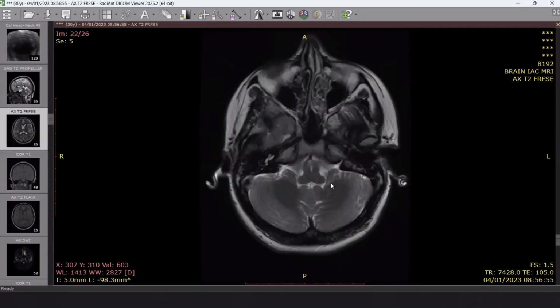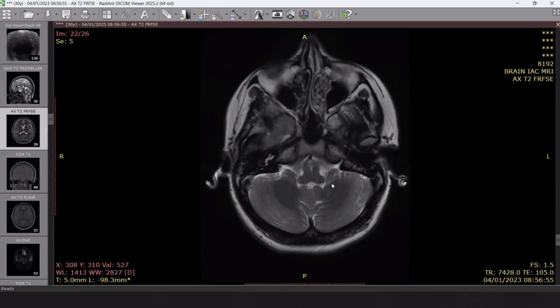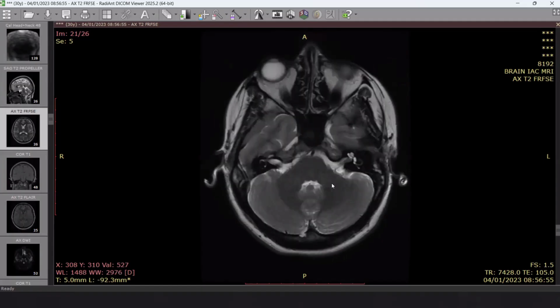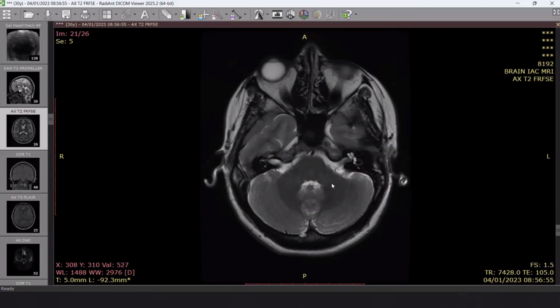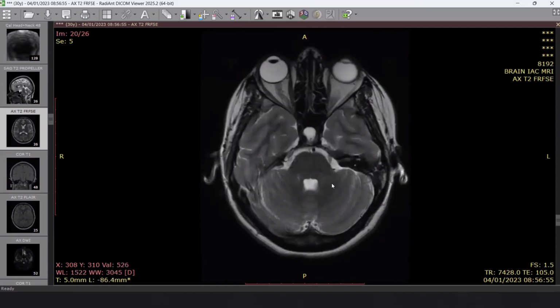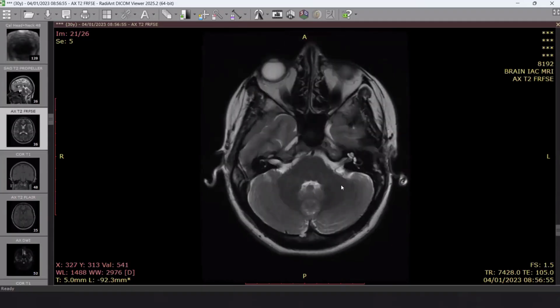Okay, very nice. I think also we should add that we need to search for any cause. Sometimes we have severe otitis media, mastoiditis, and abscess formation, something complicated. Sometimes it is complicated by sigmoid sinus thrombosis. We don't have any infection in the middle ear or mastoid air cells. Also, we should search for any complications, any venous infarction or hemorrhagic venous infarction. We don't have any hemorrhagic venous infarction.